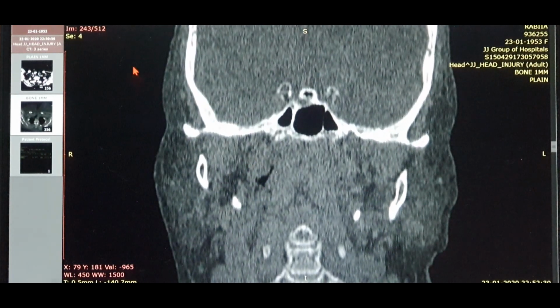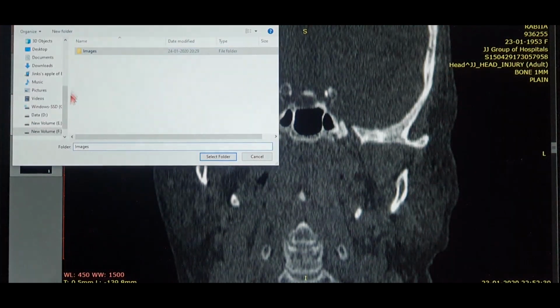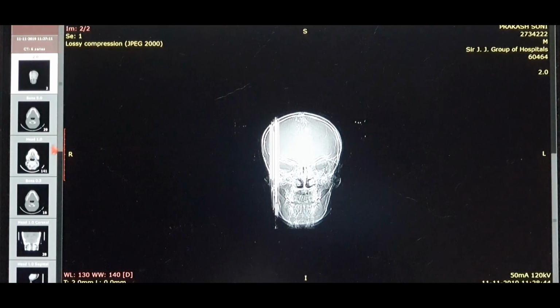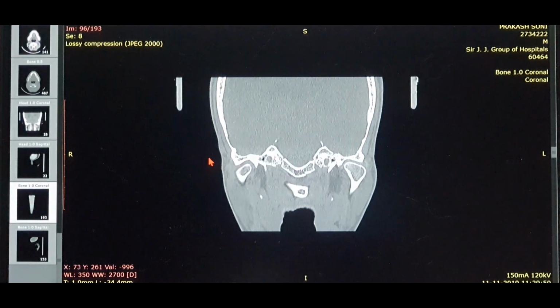As I said in my previous video, you can check in the list about how to read a CT scan for exam spotters, in which I have mentioned this is the anterior clinoid process, right? This is not much clear in the scan, so I'll show you one more scan over here. Okay, so I showed you how you can actually see the anterior clinoid process over here.